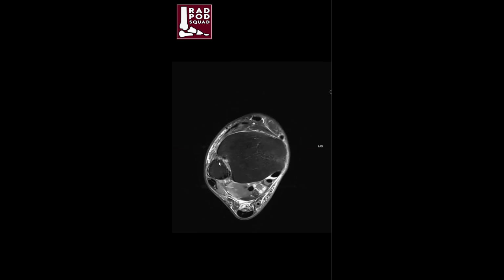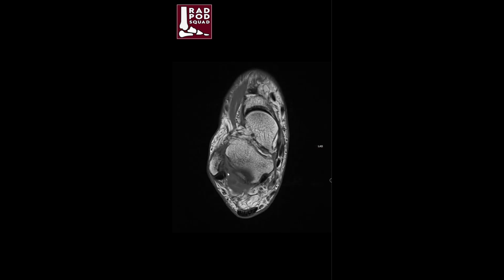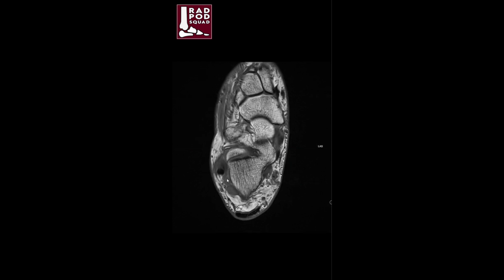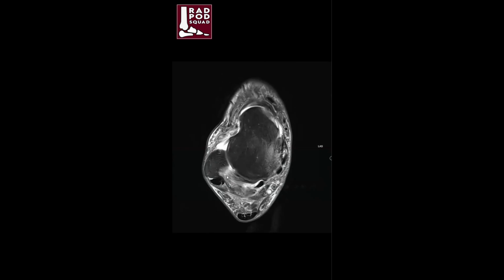Moving to the lateral side, let's take a look at the thickened syndesmosis. Gives us a clue to biomechanical changes that have occurred on this patient. Moving downstream to the ATFL sprain thickening, PTFL sprain and thickening. And here you can probably imagine that the T1 weighted image will show that this is really cellular infiltration. So this might be mass-like and create a situation of posterolateral ankle impingement. And of course, going back for the calcaneofibular ligament, we can predict that to be sprained. So subacute on chronic, severe lateral collateral ligament complex sprains.